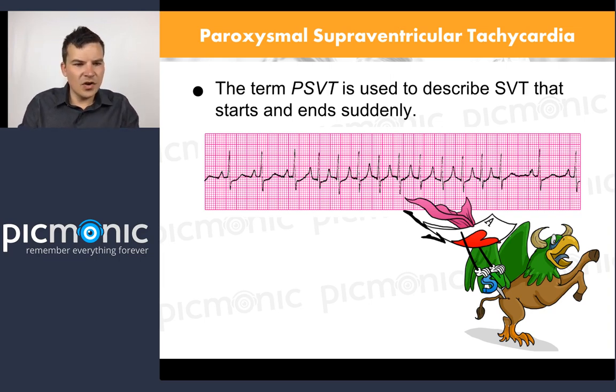But what happens is when we look at the steps, what's the rate here? Jack's an overachiever and apparently already counted 15 across here, so I'm just going to believe you. So that rate, during this 6 seconds, was about 150 beats a minute. That's way too fast. But is it regular? Is what's happening here regular?